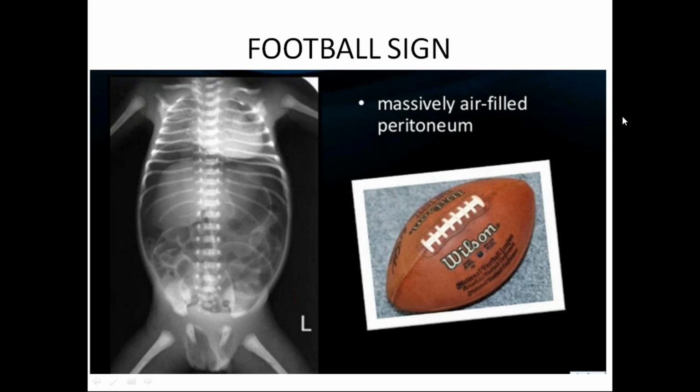And the football sign, this is usually seen in neonates with massive air-filled peritoneum, pneumoperitoneum, where the abdominal structures take the form of a football.